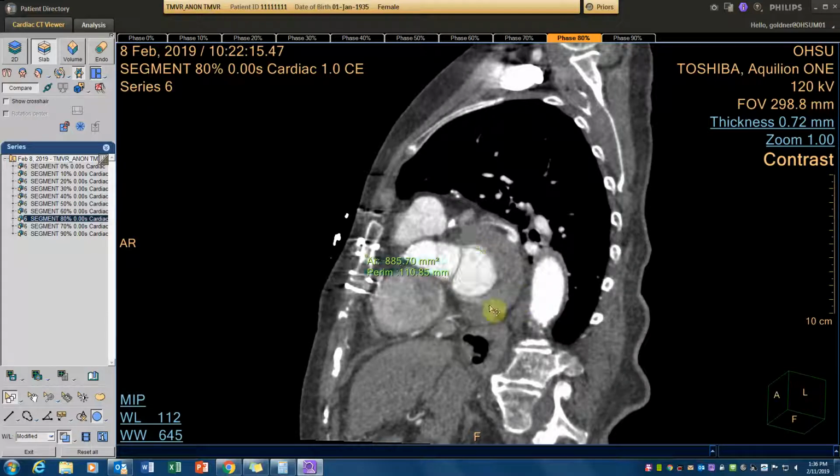There's a little bit of blood pool peripheral to the valve annulus, so that's why you see a little bit of whiteness out there. Probably bring in a couple of these, but overall that's about what you want, actually. Yeah, so nothing major measurement change there.